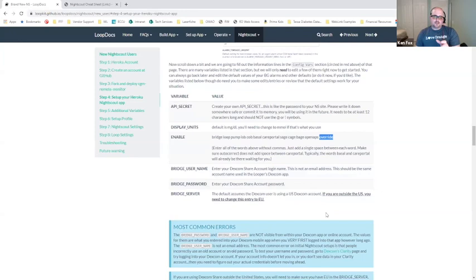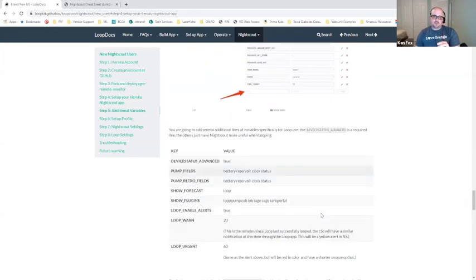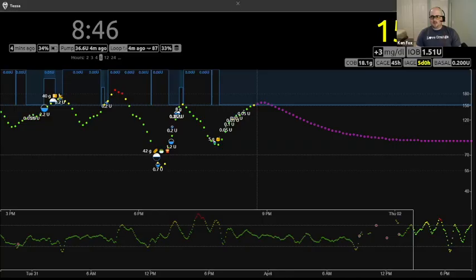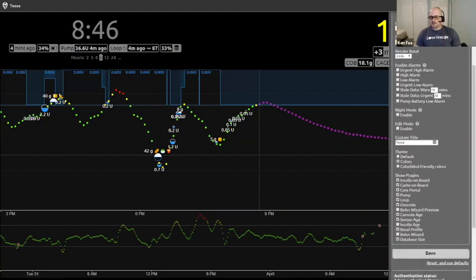The other place to look though, at the bottom when you go into the settings a little lower, the setup tells you what to put inside this show plugins right here. So show plugins is basically when I come into this menu and it right here, see how it says show plugins? I know it's very, very cleverly named. Show plugins is for showing plugins.